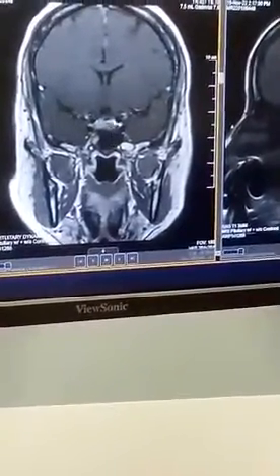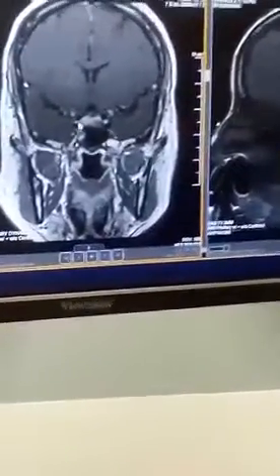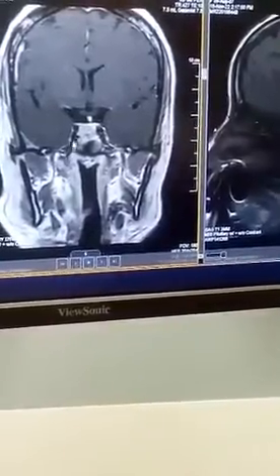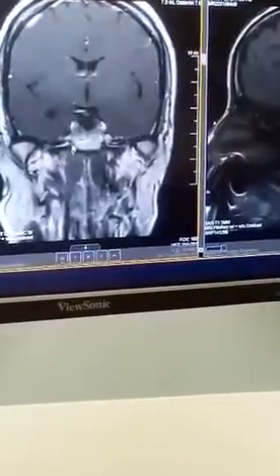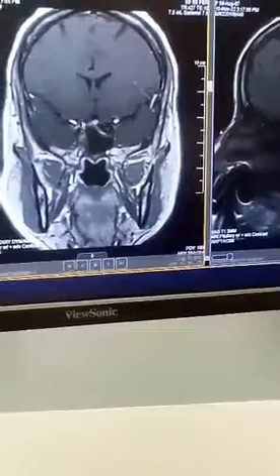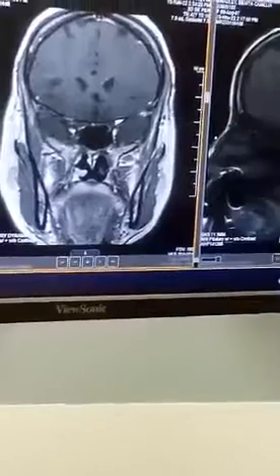But the artery is still open because it's black. Black means that there's blood flow through it. So you can follow the blood vessel here. You can see it's open. It's wide. Here's one on one side. Here's the other side, and it comes up here. Oops, went the wrong way. Up there. And you can continue to follow it, and then it leads out up to here. So I don't know what's happening here. So as long as that doesn't change, we're good.